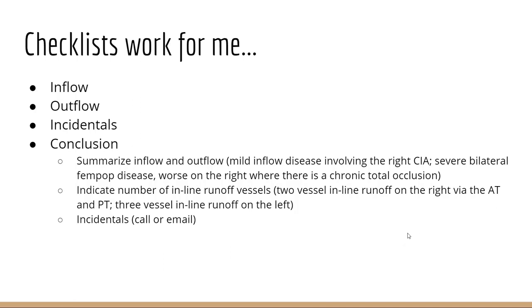Just one thing I'd like to say, when there's a lot of disease in one vessel, I'll highlight the most pertinent and severe disease, and its length, and then I'll give a descriptive statement, and I'll say something along the lines of, there's a severe moderate length stenosis due to soft and calcified plaque involving the common femoral artery on a background of multiple areas of focal mild stenoses. But just to paint an overall picture, I describe the most important and severe lesion, and then paint the picture of, there are also other things happening with the leg, or with the artery.